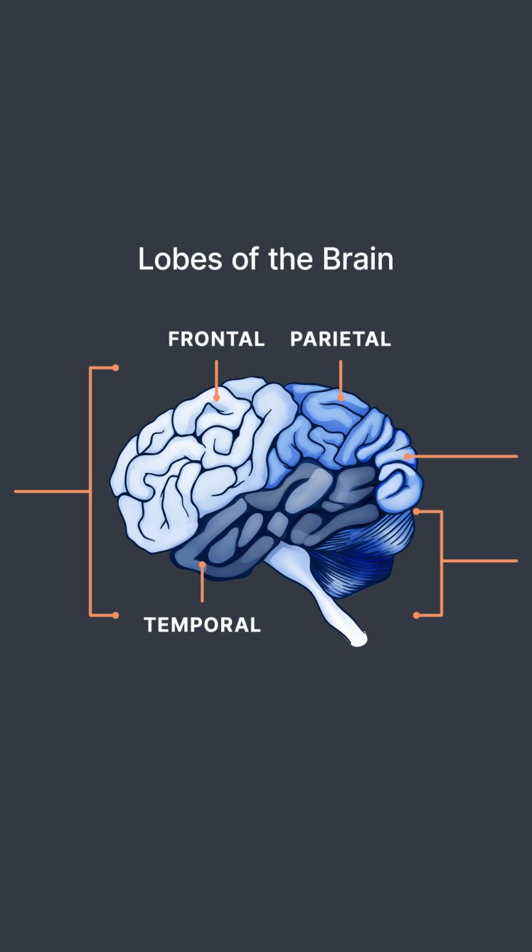The cerebellum is located toward the back of the head, below the occipital lobe and temporal lobes, and posterior to the brainstem. The brain visually appears to have ridges and valleys on the surface. The ridges are termed the gyrus, and the valleys are known as the sulcus.